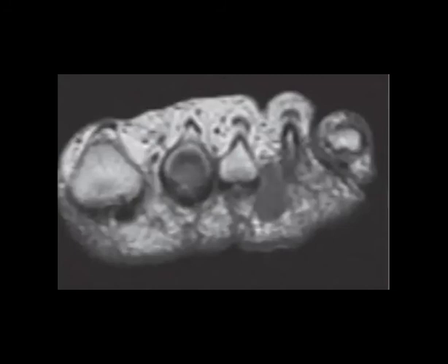You will think that there is a soft tissue here between the third and the fourth. So try to describe with me. So soft tissue signal, and in the T1 you can see that it is low signal. Do you agree? Marwa, perineural fibrosis, nice. Okay, so perineural fibrosis of Morton's neuroma.